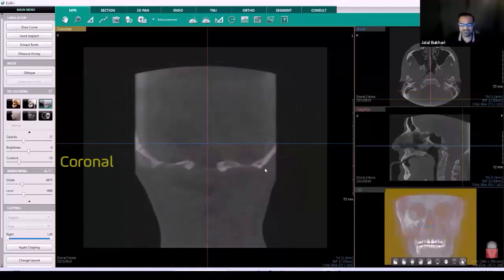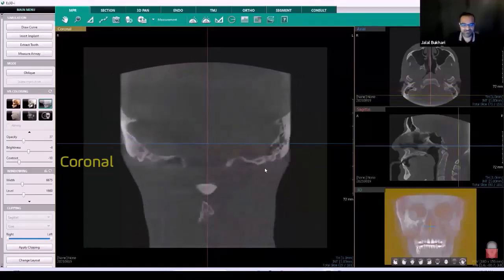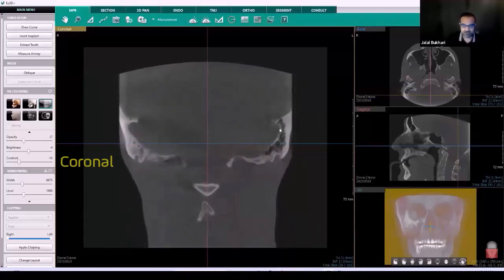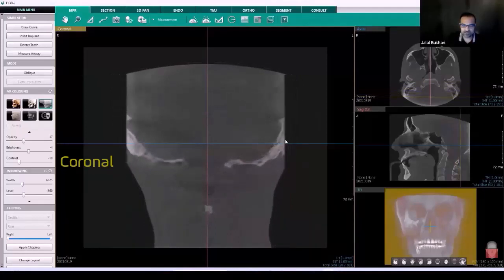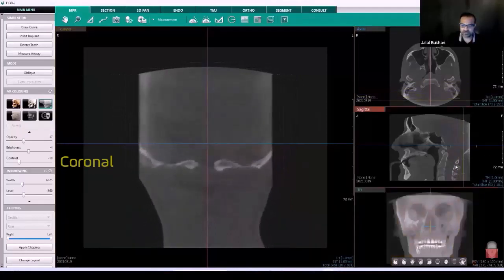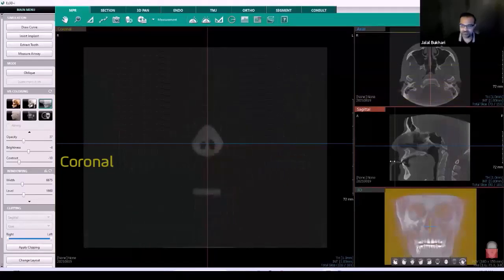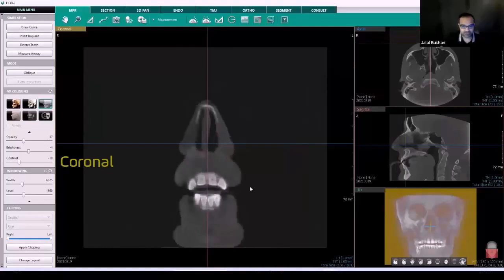Now just imagine starting the scan from here. You'd be like, whoa, what's going on here? So that's why I usually start from the very front. But nonetheless, we're going backwards, and we've pretty much exhausted our air attenuating areas. Now, I will go back and start evaluating the soft tissue regions.